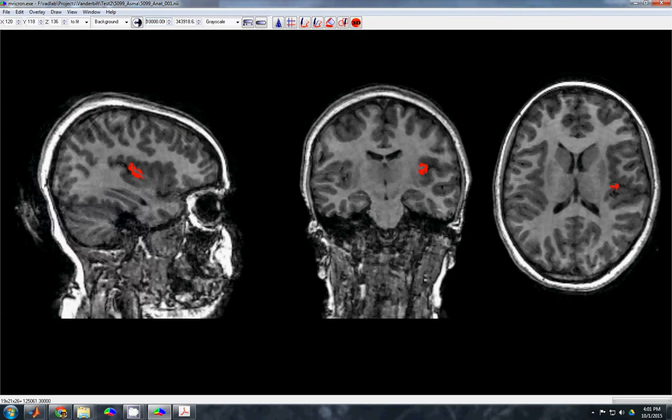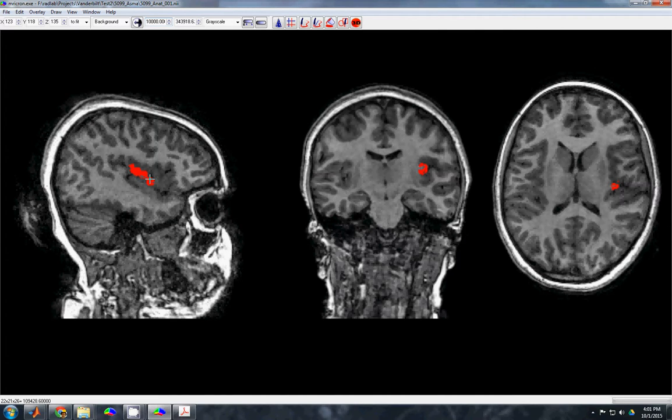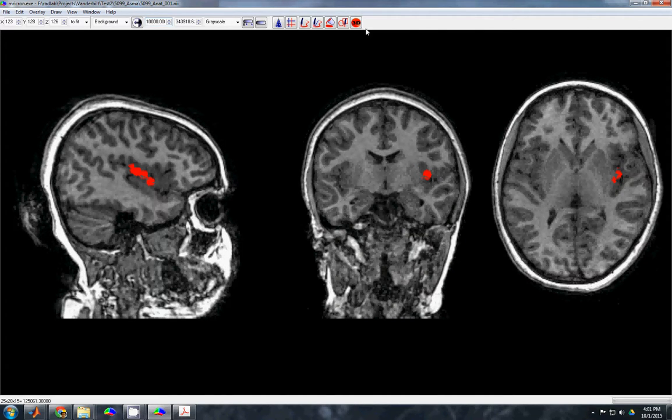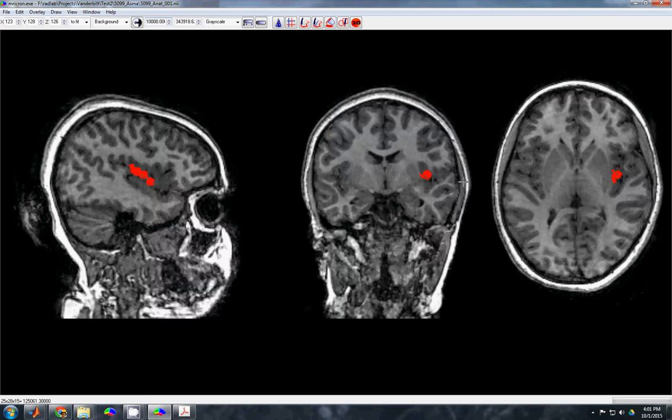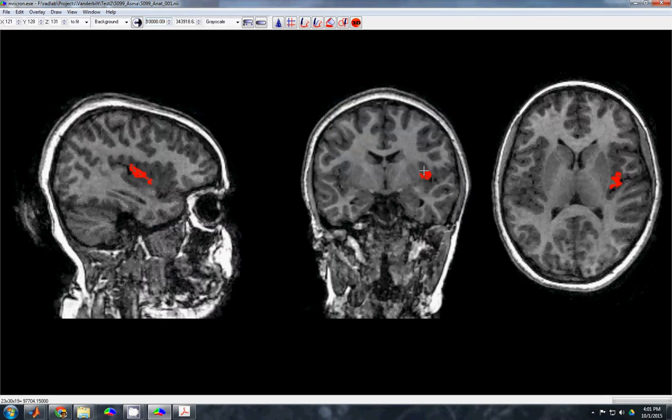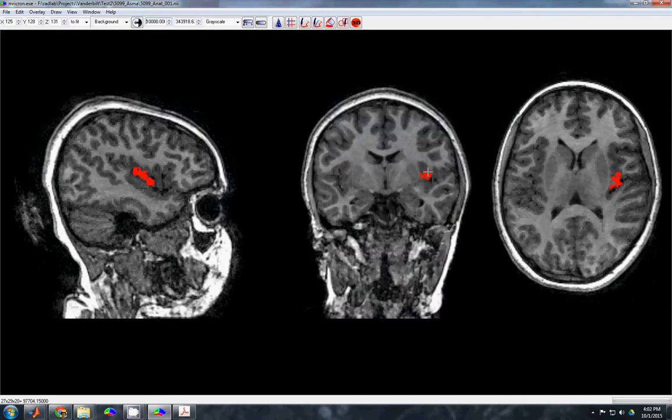Okay, that's not looking too bad. So move out to the edge. You can see I'm getting a nice filled-in coverage because the very edge of the insula is going to be pretty much all gray matter. See, that would be too far there. It's going into the white matter. There you go. Okay, so I feel pretty good about this. It looks okay in my coronals. It looks okay in my axial.